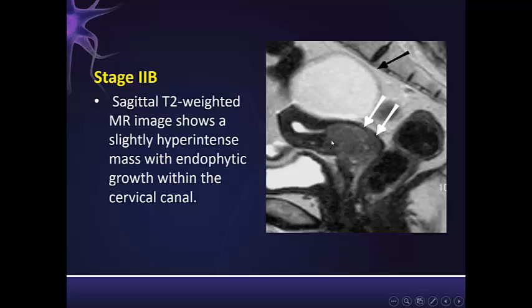This is an endophytic mass. We have the cervical carcinoma, either endophytic or exophytic mass, according to the age of the patient, according to many criteria. So this is a large endophytic mass, loss of the zonal anatomy, hyperintense. It's not like the normal hypointense signal, with entrapped fluid in the uterine cavity. And this is very important in the postmenopausal age.